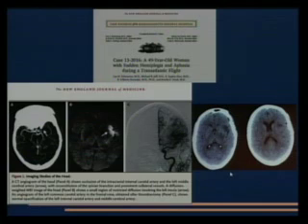But after that, they do diffusion. Why? Because if the diffusion is less than 70, they treat, no matter the time. And so they treated, and the patient recovered. This is after. This is not in the paper, in the publication, but this I got from one of the authors. Okay, but you see minimal encephalomalacia, and the patient recovered.